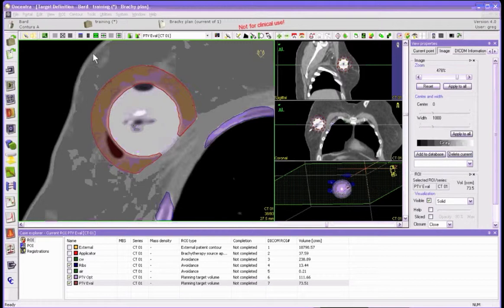What we want to do is to know what the dose is at the skin surface, so we're consistent with all the prior experience. And the simplest way to do that using dose volume histograms is to create a structure that's margined from the balloon like this, that goes outside the body, that we then crop by removing the body from it. And I'll show you just how to do that.